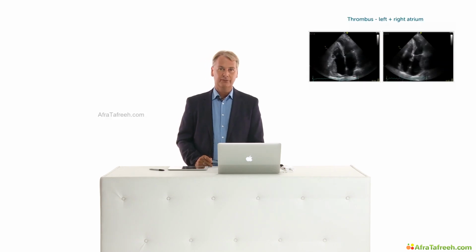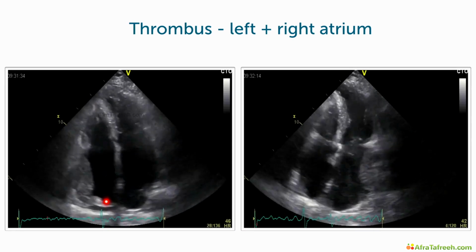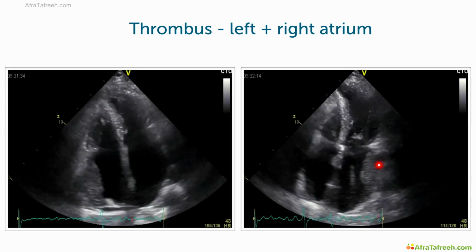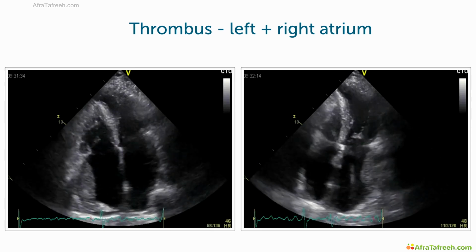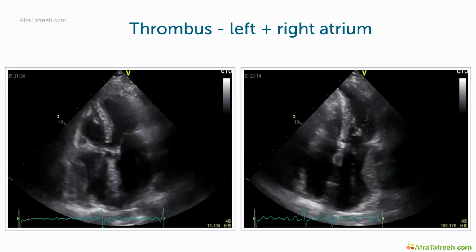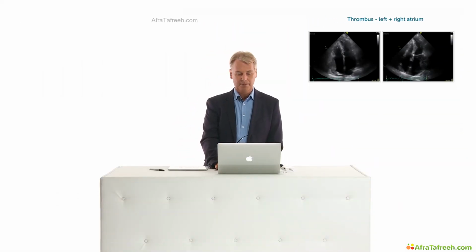We've seen a thrombus in the left ventricle, in the left atrium, and the right ventricle. The only chamber that is still missing is the right atrium. And here you have it. This is the thrombus in the right atrium. A very large thrombus, but this patient also has a thrombus in the left atrium. So we assume that this patient had some predisposition for developing a thrombus. Nevertheless, this is a patient who had restrictive cardiomyopathy. You see very large atria and poor left ventricular function, and probably also reduced right ventricular function. All of these in addition predisposed to thrombus formation.